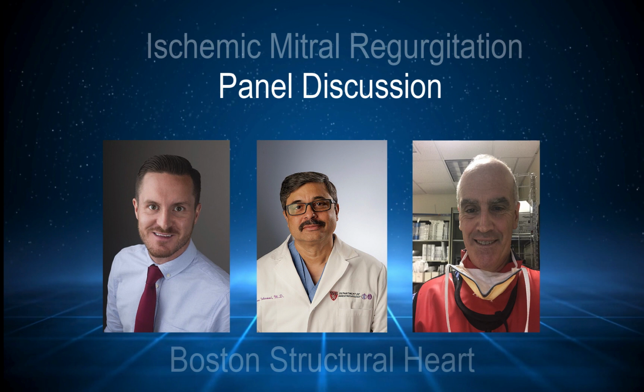And the reason why I say if I believe it was done well is that there are times when you can get a nice 4-6 beat volumetric data set with color Doppler and think you're going to trace the 3D effective regurgitant orifice area. And what you find is, as you start to align your planes on the multiplanar reconstruction or the multi-view display, right? You have that option too.